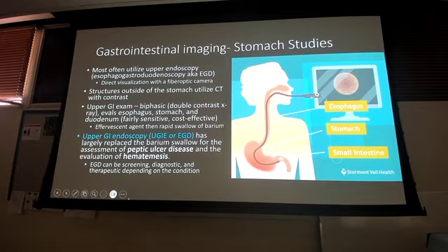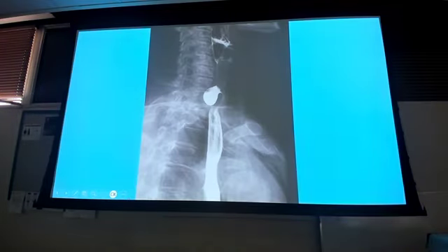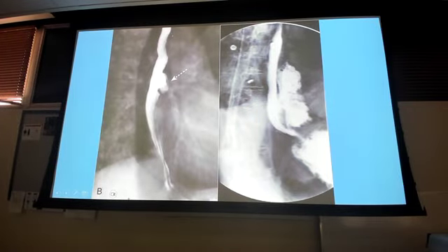That was where they didn't suspect it, basically. So when you see the perforation on the esophagus here, this was them doing a barium swallow, not expecting or seeing a perforation, and boom, there it was. Perforations in the esophagus are not very common. They're very hard to do. Honestly, I can't think of a situation outside of something you're going to learn about, like Boerhaave syndrome, where they're constantly retching, vomiting over and over, and now all of a sudden there's blood. Then maybe I'm concerned about those Mallory-Weiss tears, and for those of you who don't know if that's ENT or GI again, where you get it, but concerned about that. But in the absence of a patient coming in with that kind of history, I'm rarely ever concerned about this. So this was not expected, and it was found.